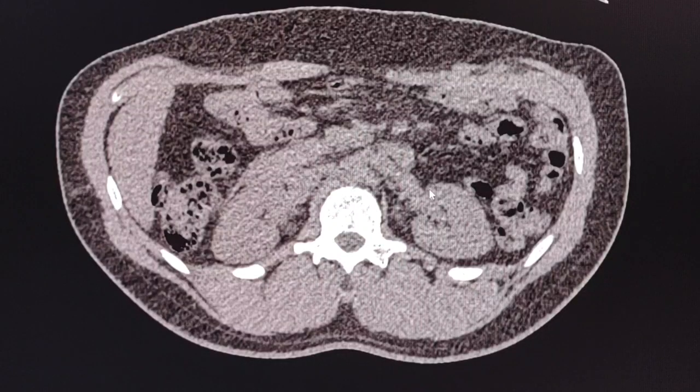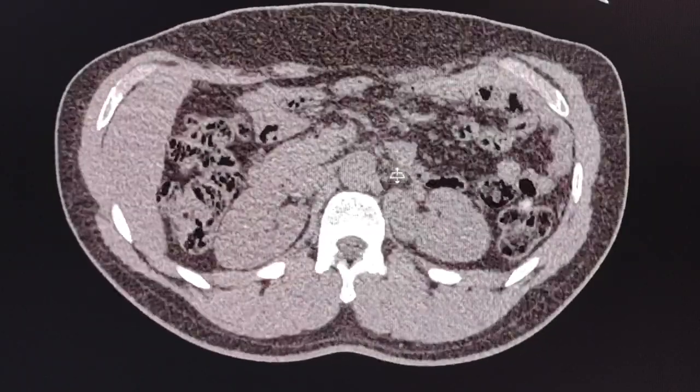This is a case of a 47-year-old male patient who presented with intermittent generalized cramping abdominal pain, and sometimes the symptoms made him wake up at nights. The clinician wanted to rule out renal pathology, so CT KUB was performed for further evaluation.